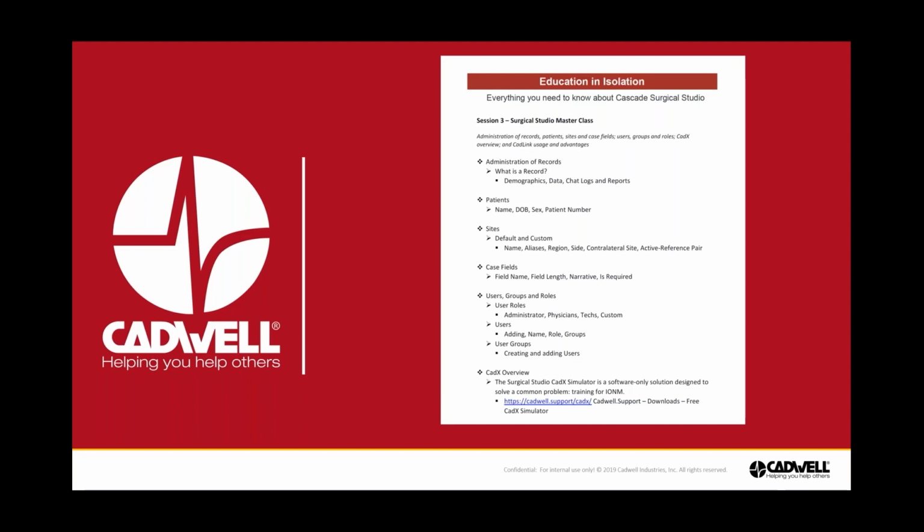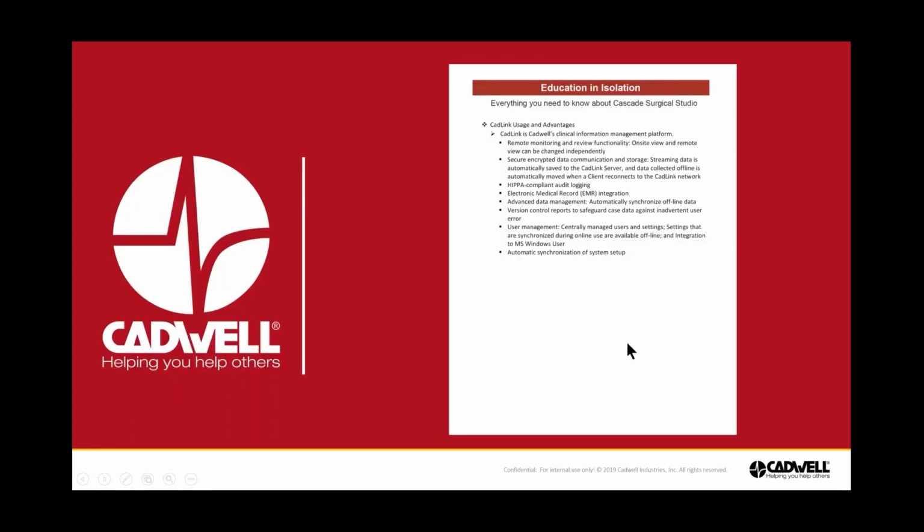This is a more detailed view of the outline we'll be covering today under Surgical Studio Masterclass. We will be discussing administration of records, patients, sites, case fields, user groups and roles. We'll be doing a CADX overview. And we'll finish up with CADLink usage and advantages.